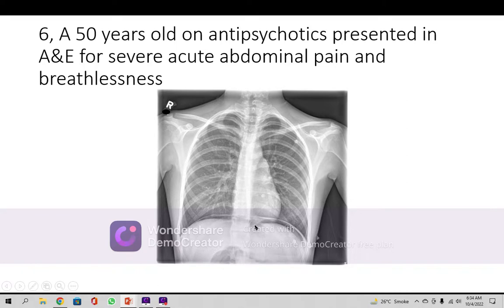So sir, there is something else seen. When a magnifying glass is used, properly seen, there is a bunch of something, just like a spiral shape, present here. This is part of the gastroesophageal junction, very near to it. The answer is that the patient has got an acute abdomen, there is probably a perforation at this site, and the perforation occurred because of this.